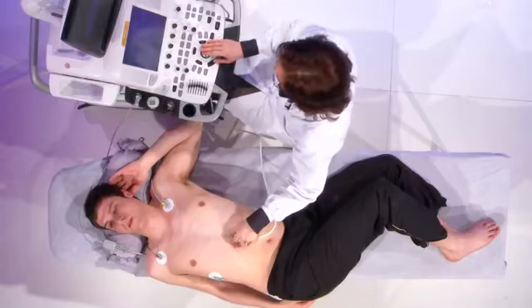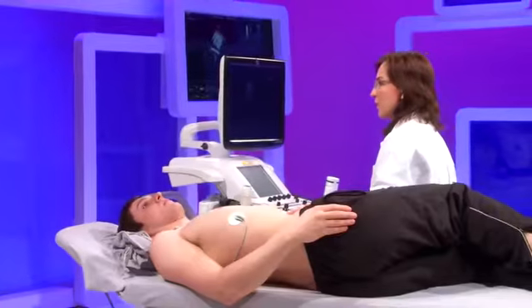So after this overall examination, I would conclude that the mechanism in this case of the tricuspid regurgitation is a functional one, and there is no criteria of severity, so we can conclude for a moderate tricuspid regurgitation. Again, this conclusion does not come from a single number, but from integrating information by morphology, Doppler, and continuous wave Doppler, and also related to the size and the response of the inferior vena cava.